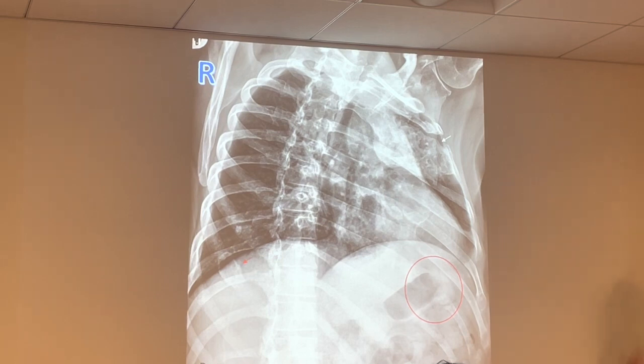You might do a chest x-ray sitting them up on their head. That might be the best way you've ever done a chest x-ray, upside down on your head. But is that the way the registry's going to ask it? No, because there's one way we learn the curriculum. It's not necessarily what we do in clinic. So don't confuse the two. We're learning this the book way of how they want you to identify these x-rays. Okay? Same with the centering thing.